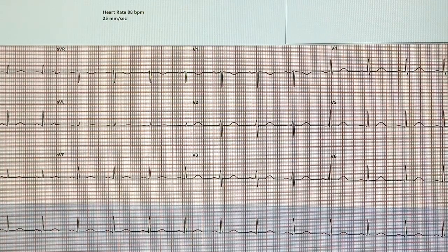Correct, all throughout. I normally would get like a paper. Let me borrow a paper. I'm gonna march it out. Yeah, but just maybe, please. I don't want to waste your big giant paper. So when I say march it out, what I mean is I get the paper, right?